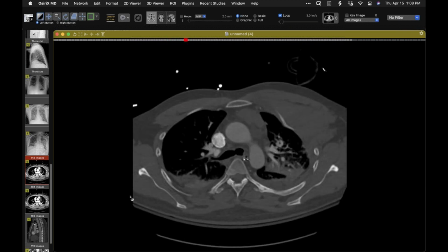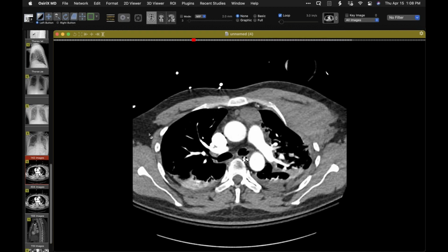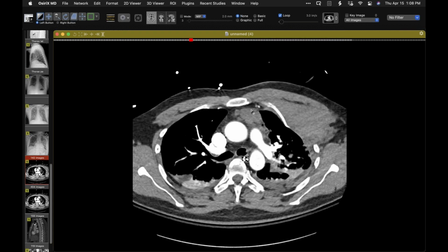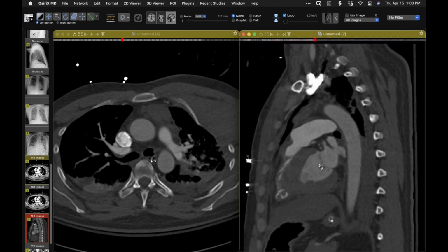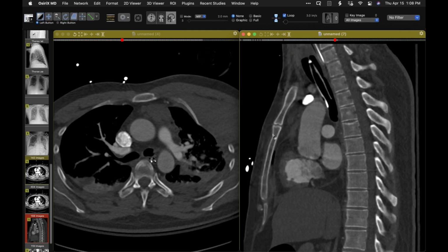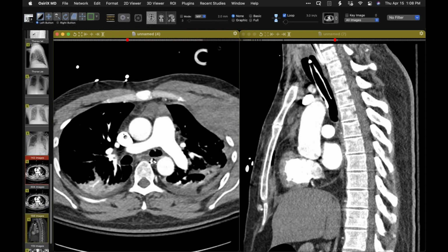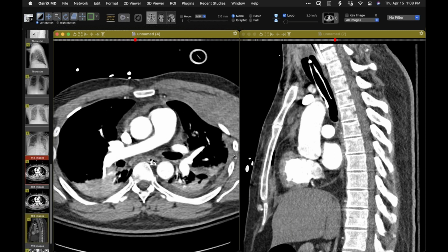So there is a before and an after here. And the before and the after on the 14th was CPR. So CPR was administered for apparently quite some time at the outside institution. So I'm going to show you quite dramatic changes that one can see from vigorous CPR.